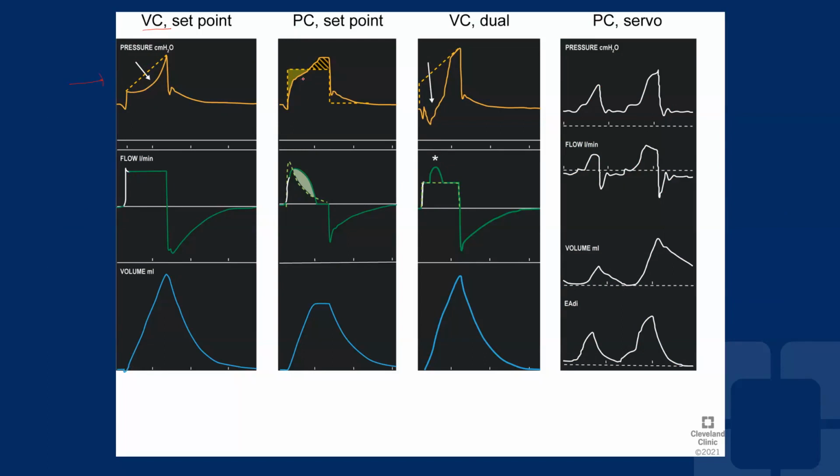In A, you see the presence of inspiratory effort. There's a little bit of the exponential decay. Then afterwards, the patient exhales. And the flow goes up and then returns to baseline. So it returns to zero. So it goes all the way to whatever number this is, and then it goes to zero.